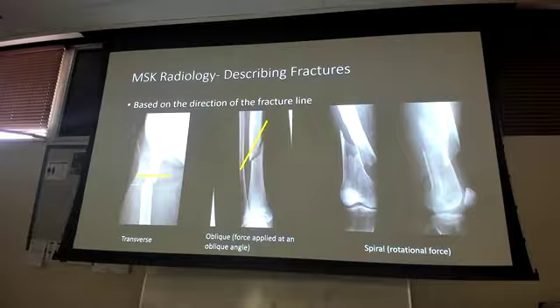You can visualize how it twisted and broke off with these two different density layers on these views right here. That's what makes it a spiral. It's not that clean oblique fracture, right? I have different depths. Here it broke here, but then it broke in a different area of the femur up in there, and I have those layering levels. Everybody see that? Okay, so that's clue 1, and clue 2 is mechanism of injury.